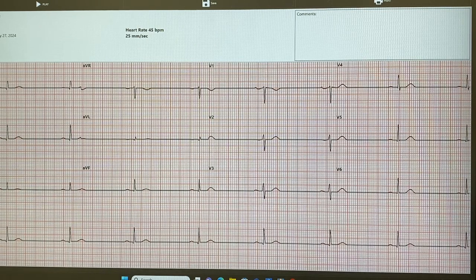So this patient probably had a medication that lowered the heart rate. What medication will lower the heart rate? Maybe a typical medication they were taking, digoxin, and what else could the patient have been taking that lowered the heart rate too much? Can't they take a beta blocker? Yes, it could be a beta blocker. Very good. Okay, X that out.